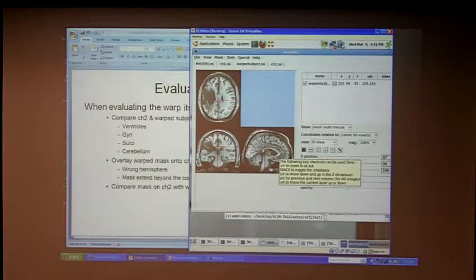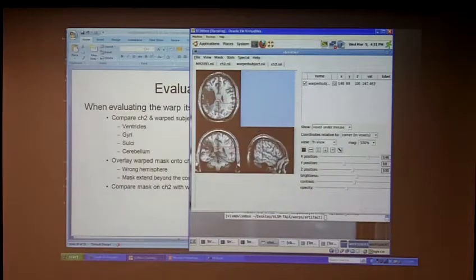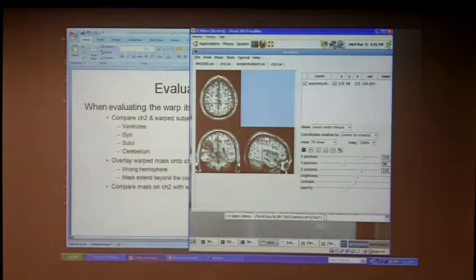Where are the focal patterns? If you zoom in on some of them, I think some of the foci are too deep. They look a little wavy in a way that's not really related to the template or the subject. Definitely. So definitely at the top right, let's turn off the crosshairs. So this sort of weird.